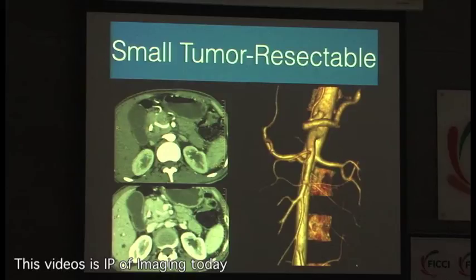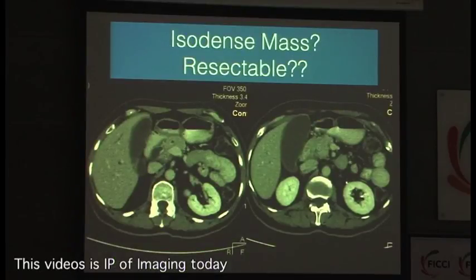So we had to tell the surgeons this, and the surgeons kind of shelled this off, but this patient developed a leak from the pancreatic jejunostomy, and because this artery was totally skeletonized, rapidly developed a pseudoaneurysm. But if you had not told the surgeon this, and he had gone and removed the head of the pancreas, the pulsations in the liver would have stopped immediately. So you would have ended up killing the patient of other causes. So the role of the radiologist is really important, and I cannot stress that enough.